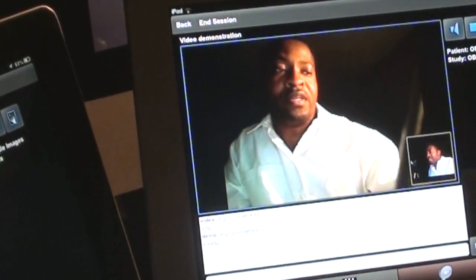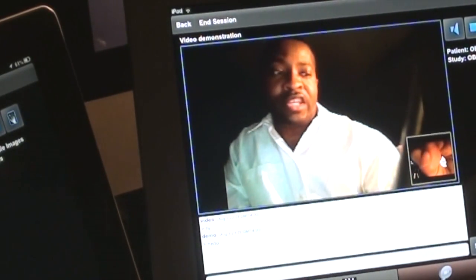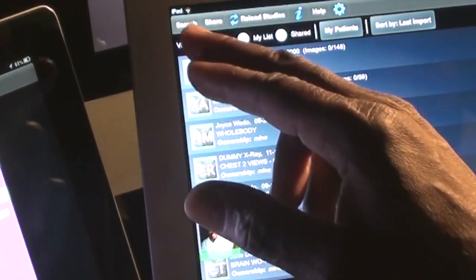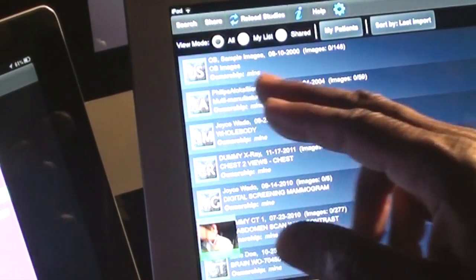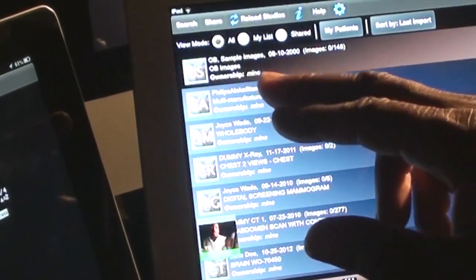Now let's take you to the actual study itself. With this icon here, we'll take you to the actual study downloaded. In this case, we don't have any studies loaded, so let's load a study here. Actually, I'm the slave, so let's load a study. No, I'm the master. Any study would do, that's fine.